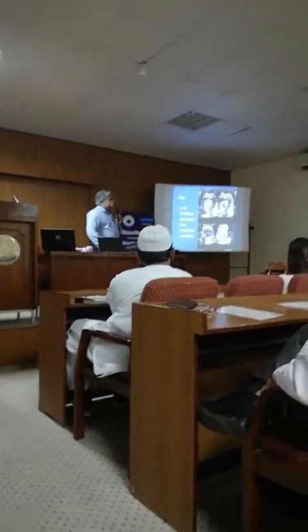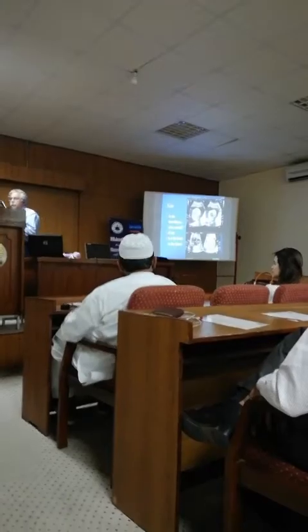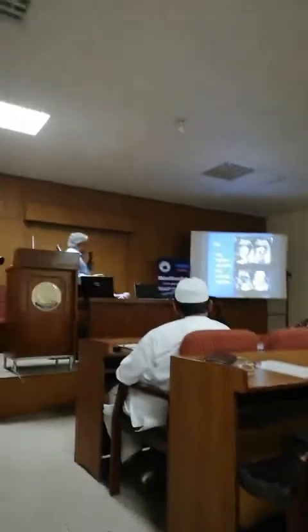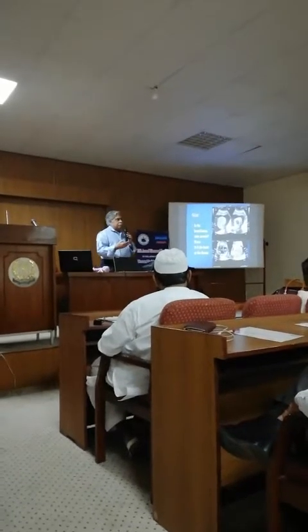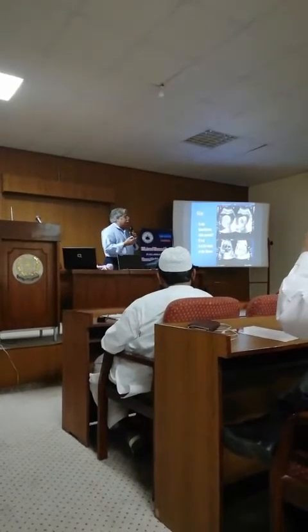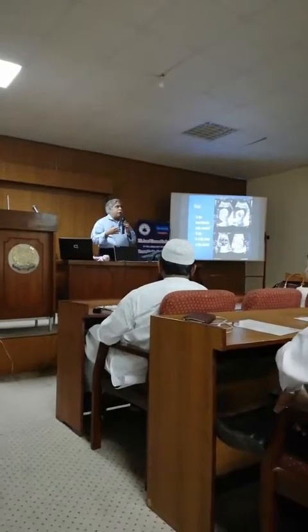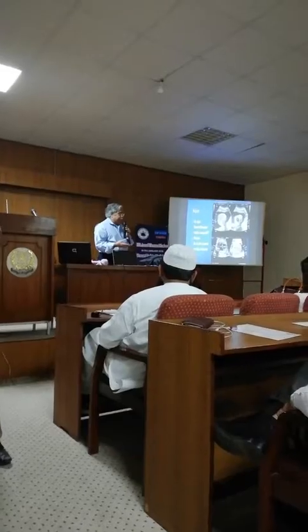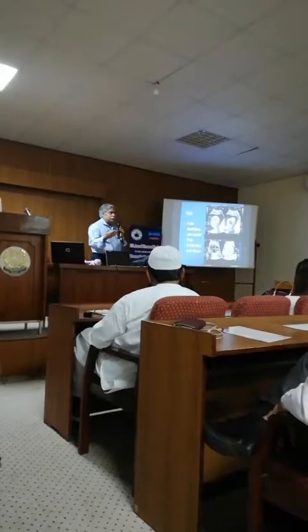So is it the heart or the chest? What about this? Do you think it is a big heart in a normal chest, or a normal heart in a small chest? How many for normal heart and small chest? Okay, about half of you. How do you diagnose that this is a small chest and not a big heart? Exactly. How much should it be?